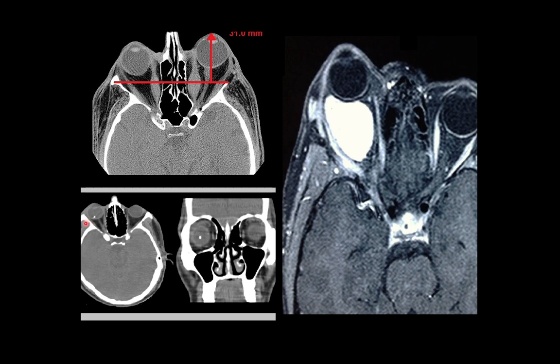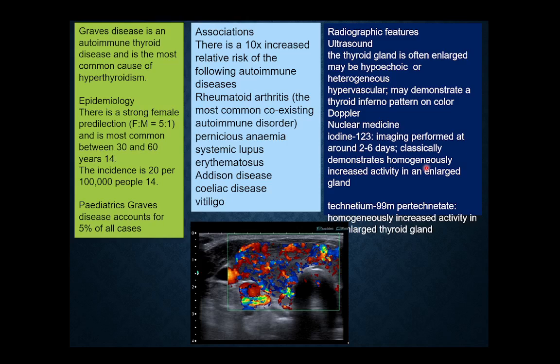Now, leave this diagnosis, but where is this located, is this intraconal or extraconal? Anyone? Intraconal, because it is within this cone, within this muscle area, in the retroorbital fat. So this is a capillary hemangioma of the retroorbital space.